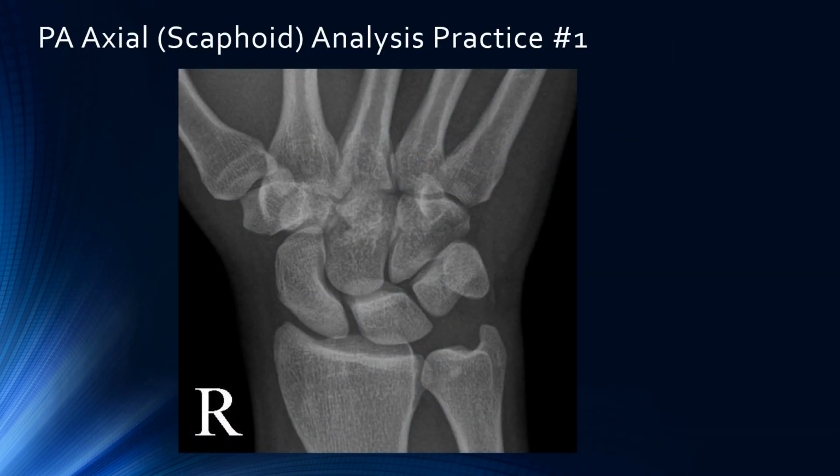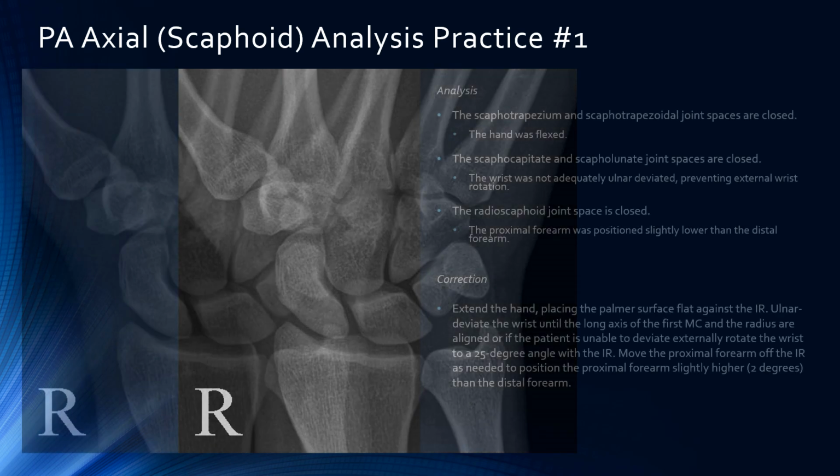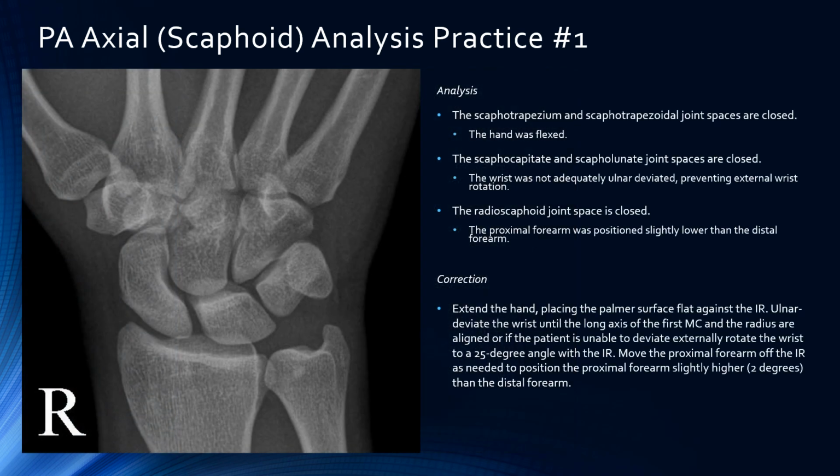PA scaphoid analysis practice number 1. What do you guys think? The scaphoid trapezium and the scaphoid trapezoidal joint spaces are closed.